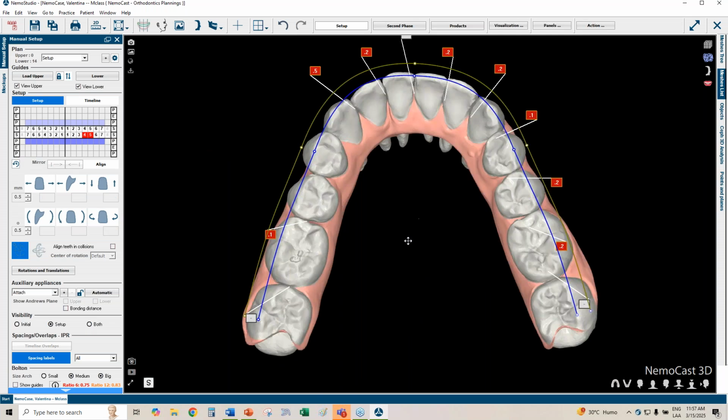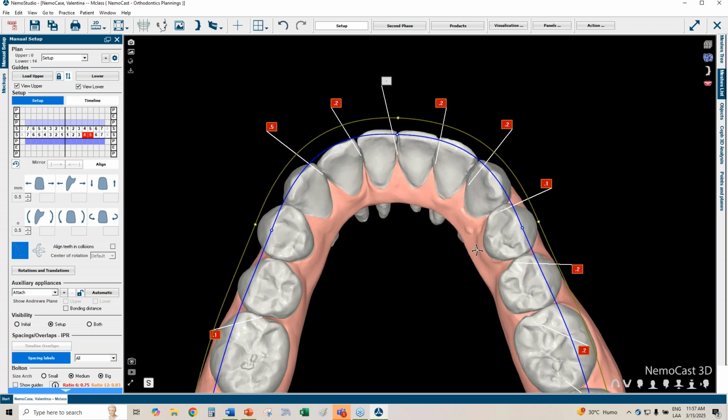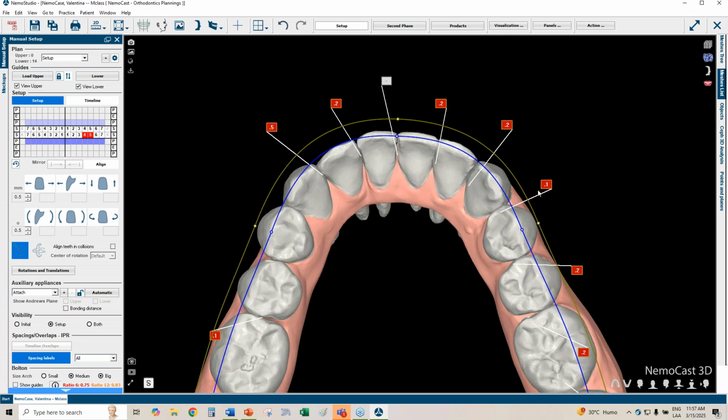Okay, and if we sum up the sum of our parts right here, so we have 0.5. This 0.1 needs, right? Sometimes if I look at them and I don't see a really good collision, for example, here it does look like it needs 0.1, but here it's more like a friction, so this one I won't take into account.